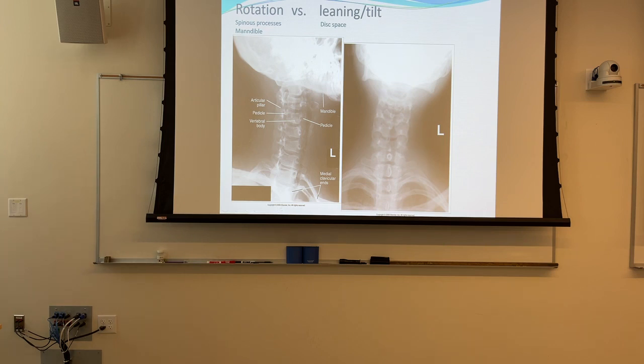All right, so a couple of different things mispositioning wise. Remember, you should be getting down to about T2, so you should be able to visualize the clavicles. And if you've got one clavicle coming across the vertebrae, you've got some rotation, so this patient will be into an LPO. I really think that this was a botched oblique rather than a botched AP, because surely you would not look at the positioning of this person and think, yep, that looks like a good AP, right? So I think this was a botched oblique, but it kind of makes the point.